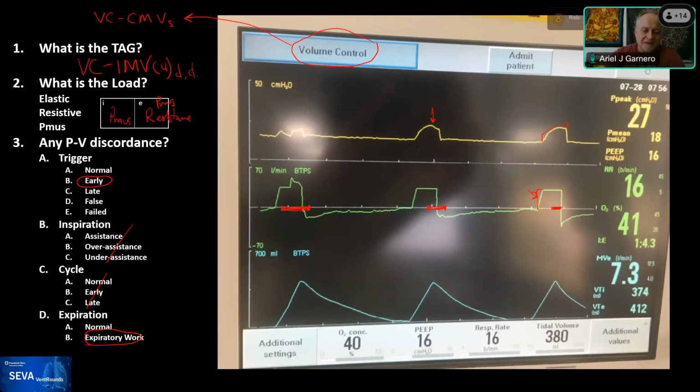Eduardo, I must correct myself because it could be an obese patient, and I guess I rushed into talking about it. So I could be completely wrong. Yeah, that's why I said you can't make an assessment without the history, and that's one of the limitations of this, Ariel. So that was implied.